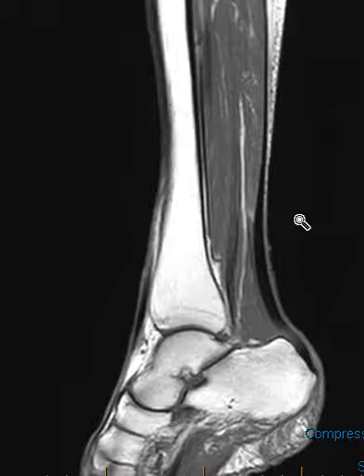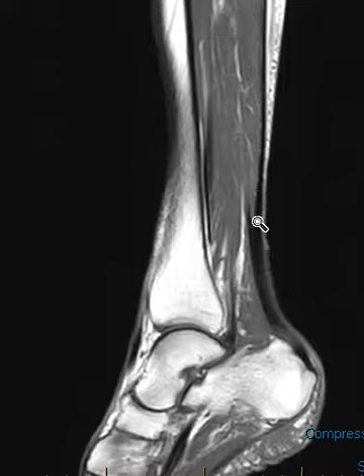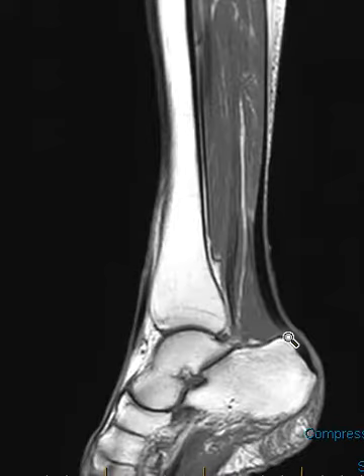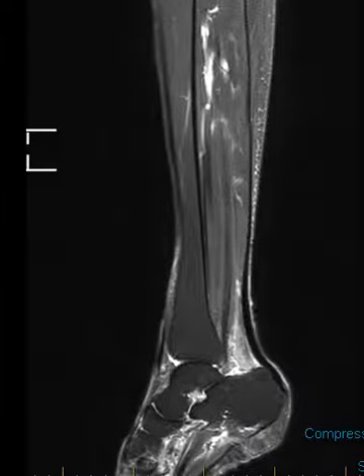The leg muscles look good, and the Achilles tendon coming down here, we see it nice, dark, smooth, and uniform. Had no abnormality of the Achilles tendon, but in front of the Achilles tendon we have a fat pad here. There should be bright fat like in the marrow or in front here, and instead this is infiltrated with inflammation. And this is Kager's fat pad, and when we see this inflammation we call it peritendinitis.